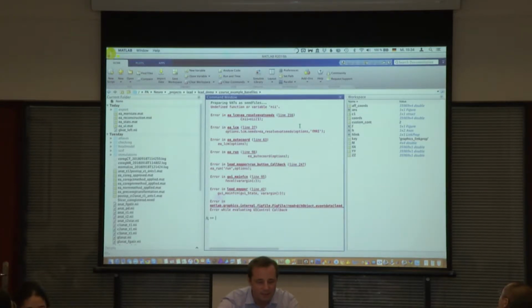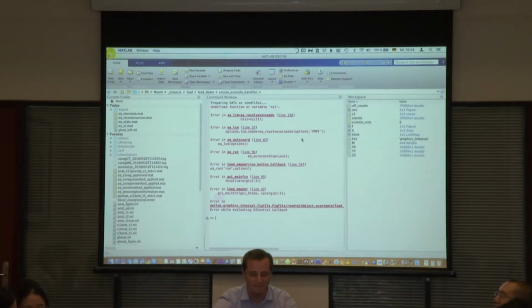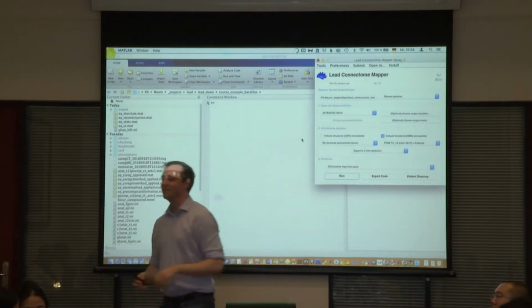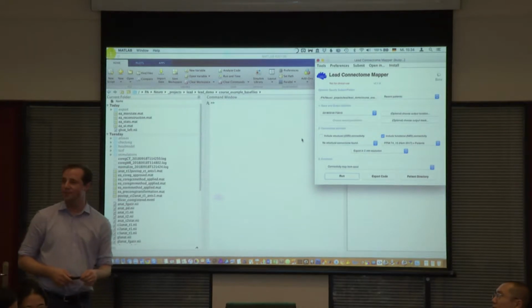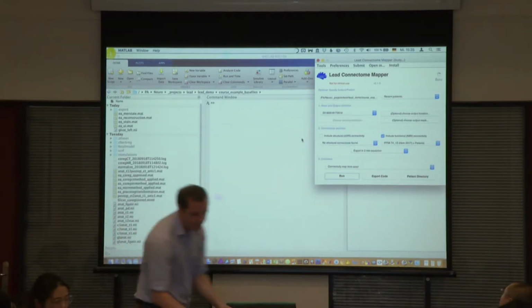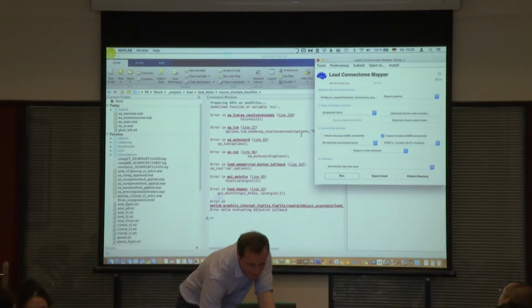That doesn't work. Andy, I got lost. So you get lost? Okay. You are using your own patient data at which point there? What is the use of your patient data? The VTA. Just the volume. Yeah. And apparently it didn't work, so there seems to be a bug. Sorry about that.